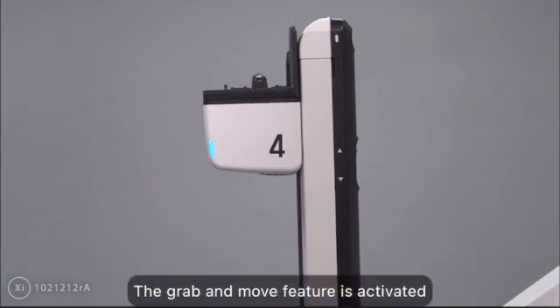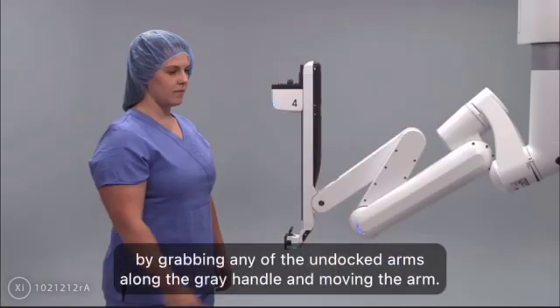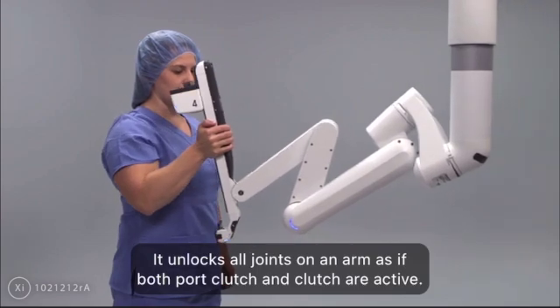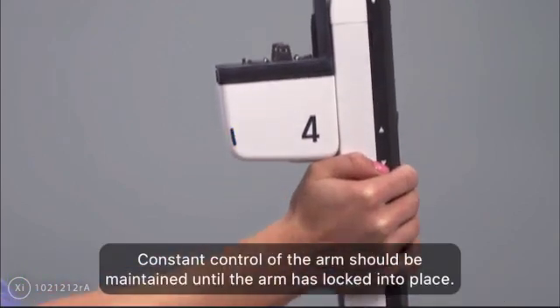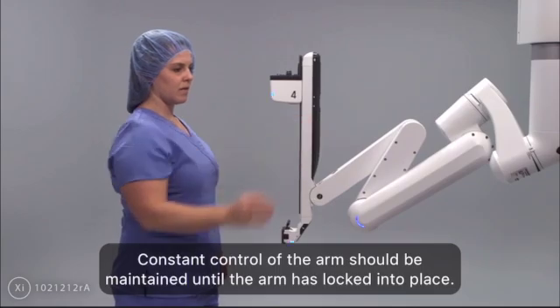The Grab and Move feature is activated by grabbing any of the undocked arms along the gray handle and moving the arm. It unlocks all joints on an arm as if both port clutch and clutch are active. Once movement has ceased, the arm will lock into place. Constant control of the arm should be maintained until the arm has locked into place.